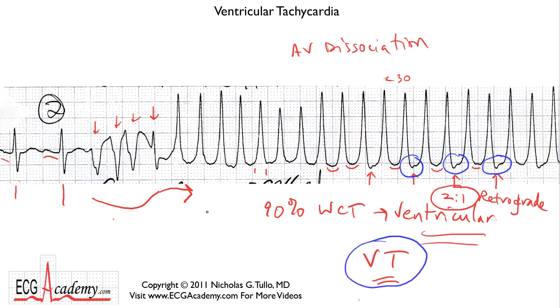I think in general, people look for excuses to not diagnose VTAC. They're always making up some reason that, well, this might be AFib with aberrancy or something like that, because they're afraid of the consequences of giving a patient this diagnosis. It really does open up Pandora's box. But if you want to be an ECG expert, you have to be able to call it as you see it. And this is absolutely clear in my mind.